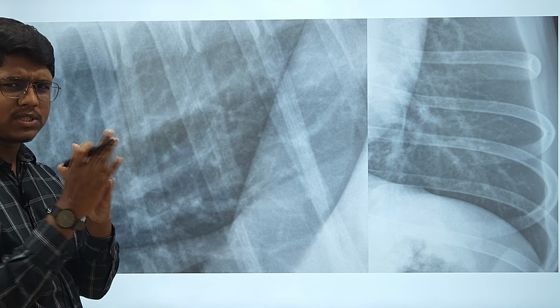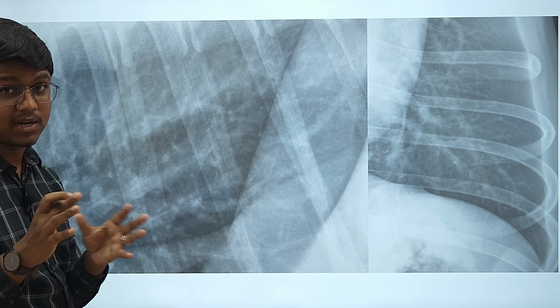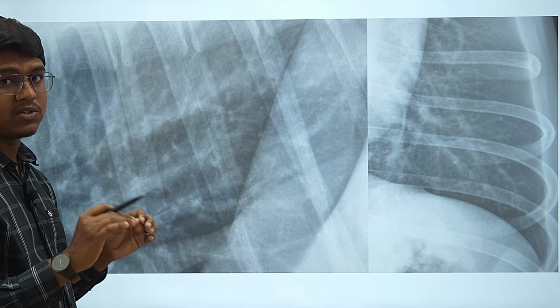Okay, you have to see also the radiographic signs and also the clinical signs, the signalement, all those things we have to correlate, especially while evaluating the lungs. Okay, it can be very tricky due to heterogeneous opacity.